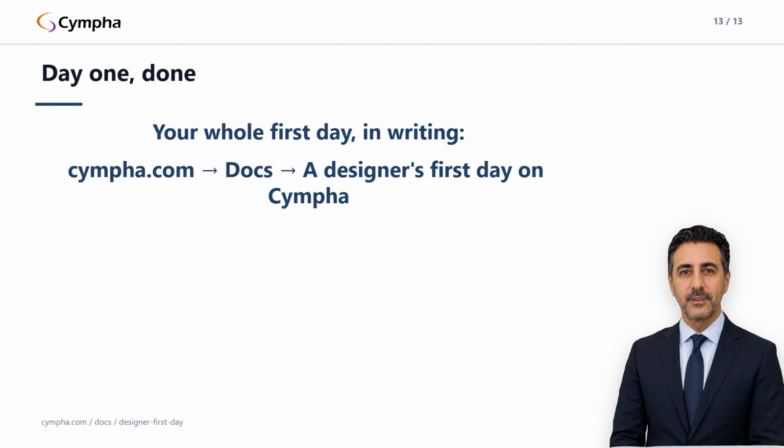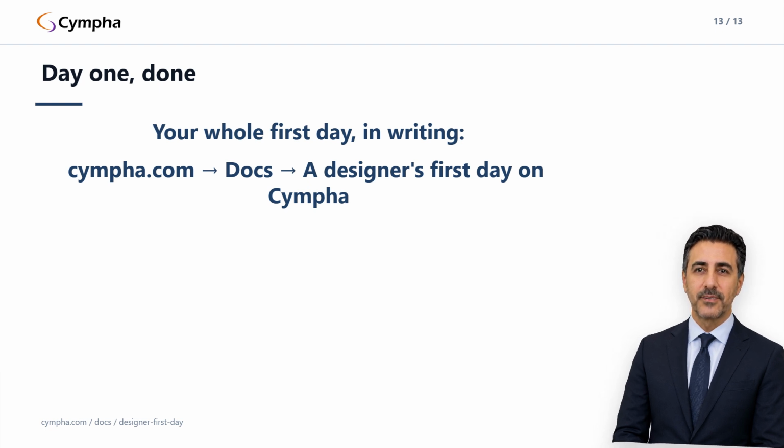Approved, paired, workspace set, one case read, designed, uploaded, and handed back for approval. From tomorrow, it's the 2-minute loop. A case arrives, the files are already sitting on disk. You design in the tool you already know, save into the patient folder, and request approval from the browser.